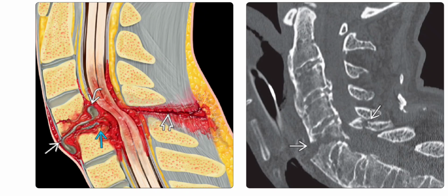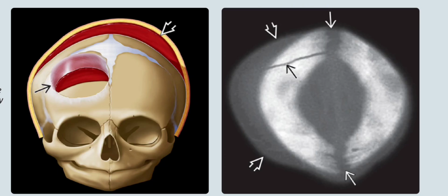Right is the sagittal reformatted bone CT of a cervical spine fracture in a patient with ankylosing spondylitis, and it nicely shows the bone injuries but does not depict the extent of soft tissue damage. So MRI is basically complementary to the multiplanar CT. So some more images of scalp and skull injuries.